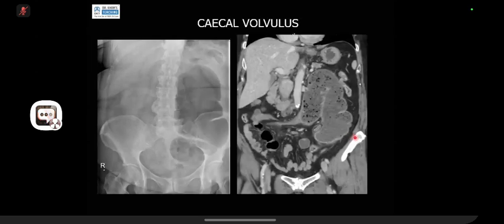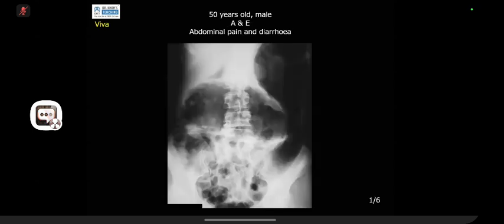This is the CT scan of the same case. On a coronal sequence, you can see this is the ascending colon. It has come here and this is the inverted type of appearance. Actually, this thing is the ileocecal junction. So this is the CT scan of the same case. Yes, exam favorite hint. What is this? Toxic megacolon. And why do you say that?